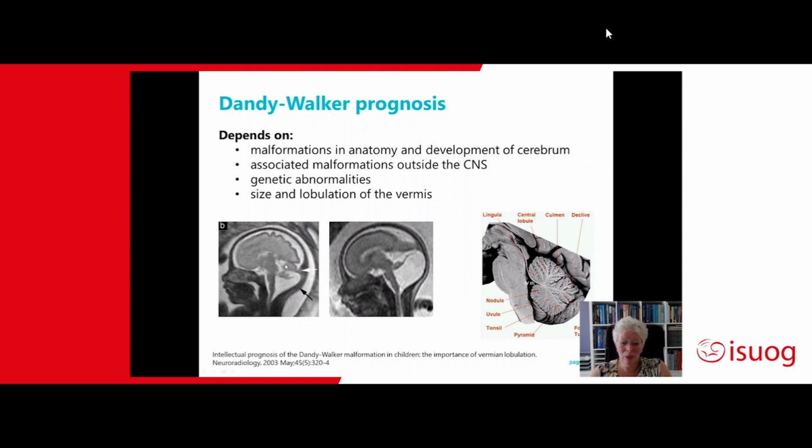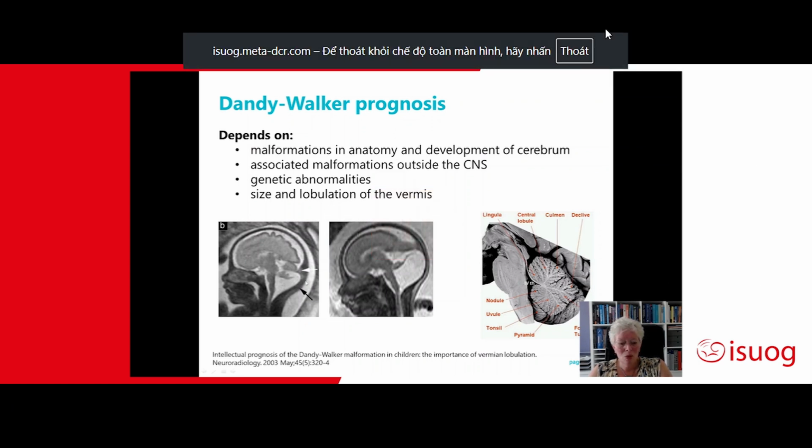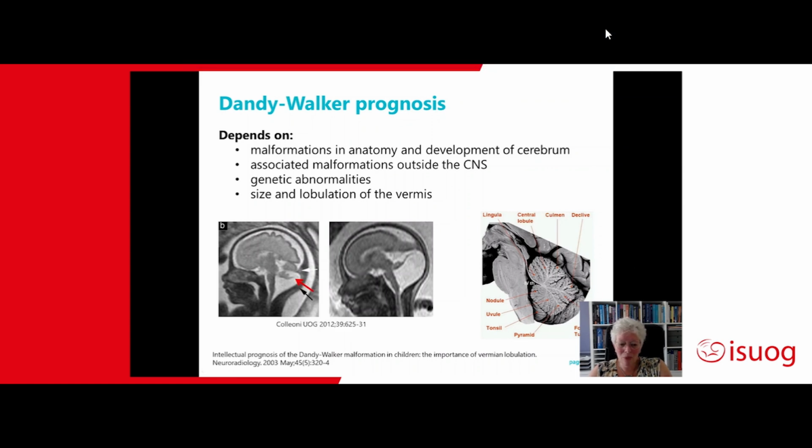If we look at these two babies, fetuses, we think that the development of this baby will be better than the development of this baby, because here is more tissue developed.